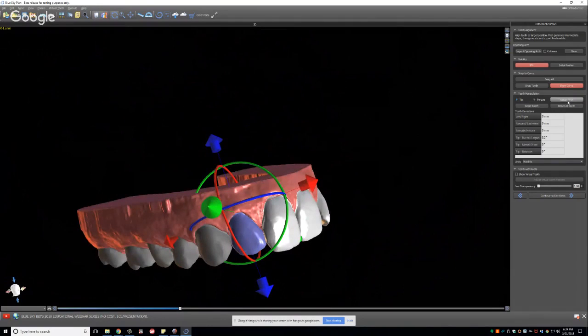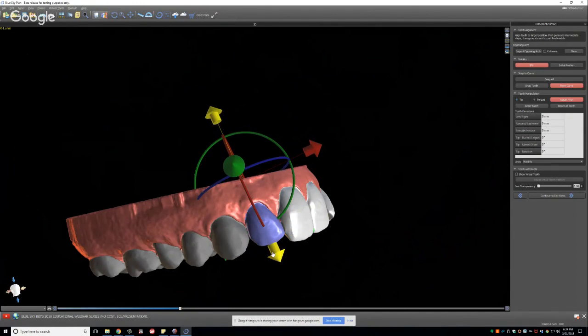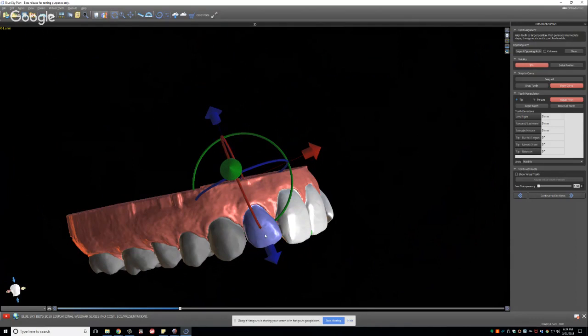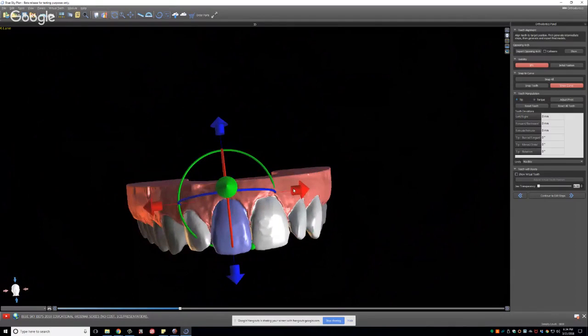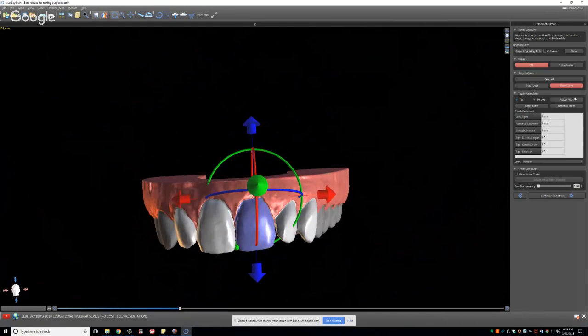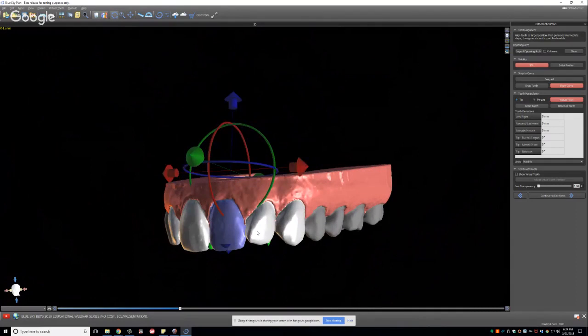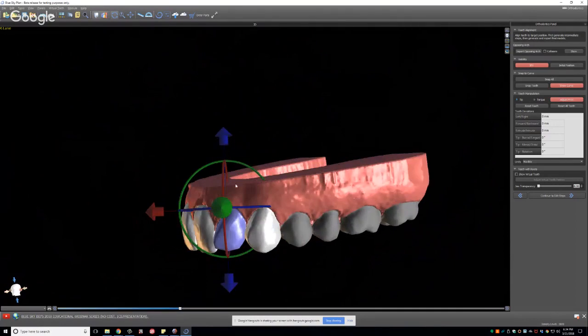So the very first thing I do, let's go ahead and reset that tooth, is I click Adjust Pivot after I've aligned it, and I bring it down a ways, so that on this lateral incisor, I probably go to the middle third of the tooth. And this is one of the updates that is coming. We have now put together a process that actually pre-calculates this, brings it down farther on each tooth. So don't worry, it's a very soon update. You won't have to mess with this, but it's a quick process, not a big deal. It takes about 20 seconds to do it for all five teeth, and it will make the overall alignment of teeth much more efficient, in my experience.